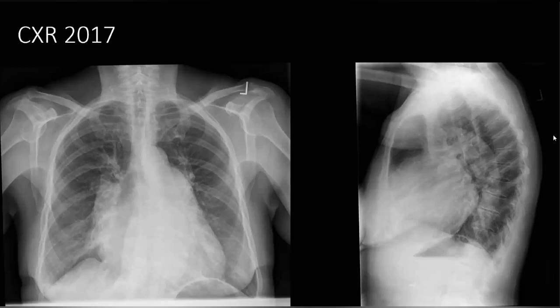Although I don't see the actual calcifications, considering the bilateral symmetrical hilar lymphadenopathy, other differentials would be lymphoma, although lymphoma is not that symmetrical, and TB could be a differential, but this is also less likely.